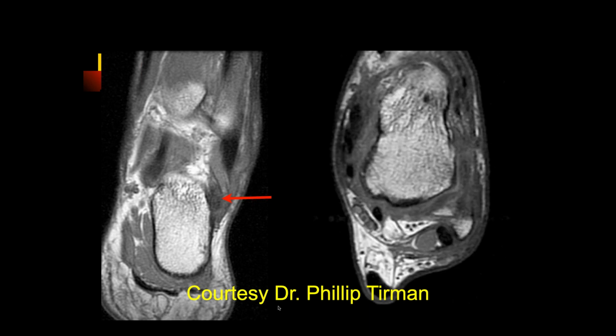Okay, so the red arrow is pointing to... This patient had lateral ankle pain. I'd like to see that on the sagittals and the axial. Okay, so there's actually, within the lateral aspect, an accessory peroneus quartus muscle. But I don't see it anteriorly.